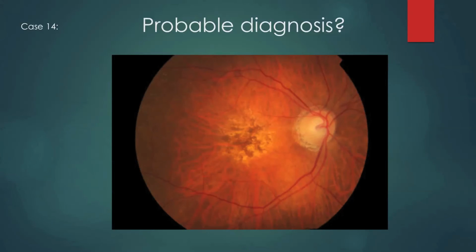This image is of excellent quality, and there are probably 2 reasons to refer the patient. First, there is macular degeneration. The center of the fovea has an obvious abnormality, and it is considered geographic atrophy with pigmentary changes. I'm also concerned about the optic nerve. The optic nerve should lead to a referral even without the retina because the cup to disc is about 0.8. And it's hard to tell for sure because it's slightly tilted, but this may be glaucoma as well.